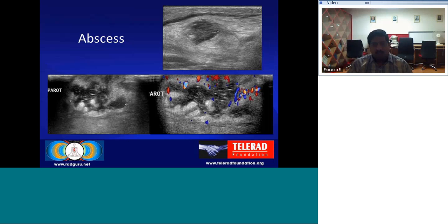An acute inflammatory process can give rise to an abscess if prolonged without treatment, or with other factors like obstruction or immunocompromised status. An abscess is like an abscess in any other part of the body, where we see a heterogeneous echo texture with central liquefaction without flow, and there can be layering or internal motion of the fluid, thick fluid contents that we see in any other abscess.